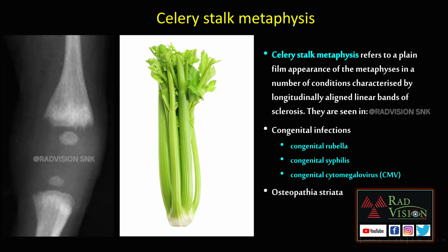Next, here you can see there is broadening of the metaphysis, and there are multiple linear bands of sclerosis noted in the metaphysis, which makes the celery stalk. So that's why these are called celery stalk metaphysis. Remember, making the celery stalk. This is the celery stalk.